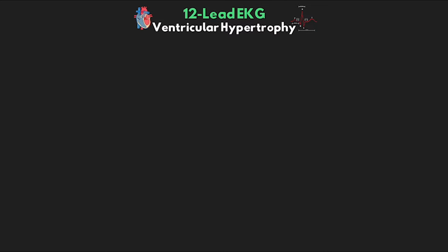Alright, so to get in and start things off, we're going to begin talking about our QRS complex wave composition. We previously discussed the composition of this QRS complex, usually consisting of our Q, R, and S wave. That said, we don't normally see all waves in all complexes in all leads. The waves that we see are combinations of the combined average direction of electrical activity in the heart at that moment in time, relative to the electrode that's looking at the heart.